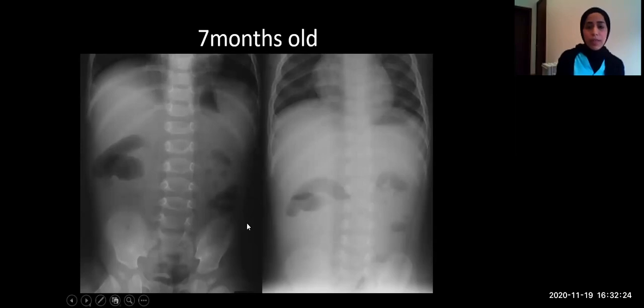And additionally, if you look at this bowel loop, you can see an abnormal cut-off of the inferior margin with a crescent-shaped appearance. So you have a paucity of gas in the midline of the abdomen, abnormal featureless loops here, with a crescent-shaped bowel loop in this lower left abdomen. These are alarming features of underlying bowel obstruction and are commonly seen in intussusception.